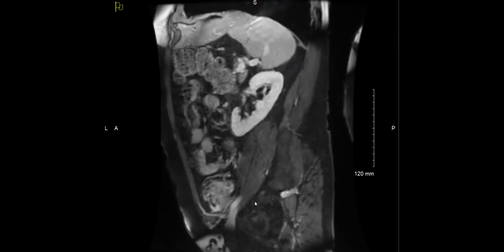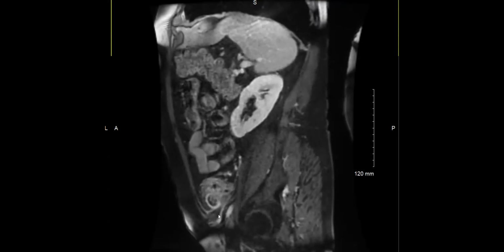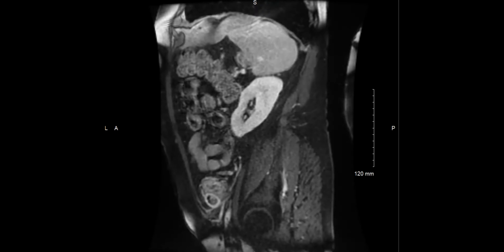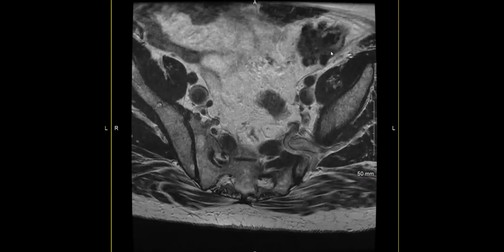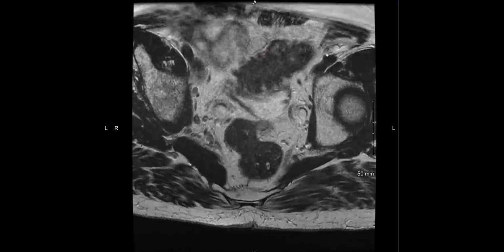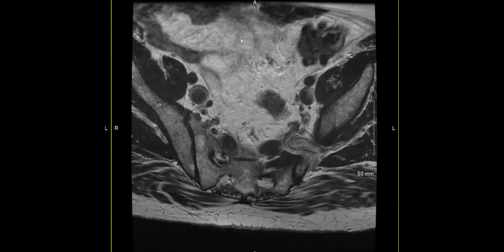Is that okay? Yes, that thickening of the fascia, I think that was the key finding because that's how you distinguish from colon cancer. Because with colon cancer, you don't see that stranding of the fascia from the edema, whereas with diverticulitis, you do. Right. And in this case, actually, we did catch it on T2, and you can see that the wall is edematous here. You can see that the fascia is also edematous. Pretty cute finding. Great cases.